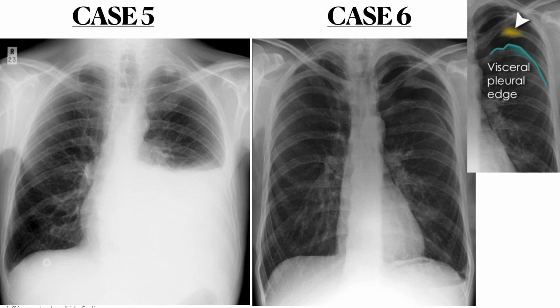So in that patient, we have pleural effusion on the left lung.